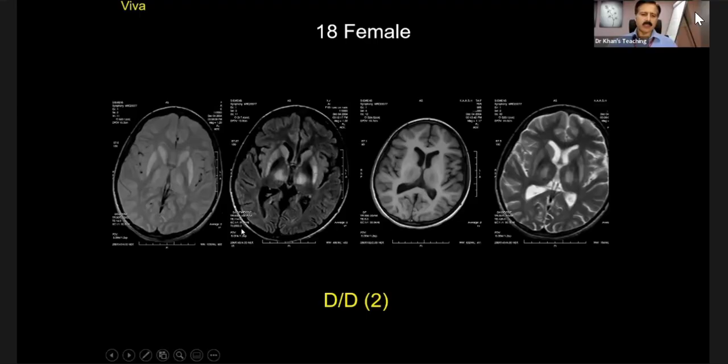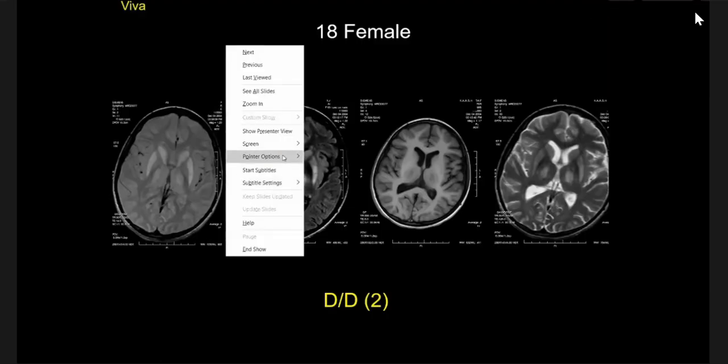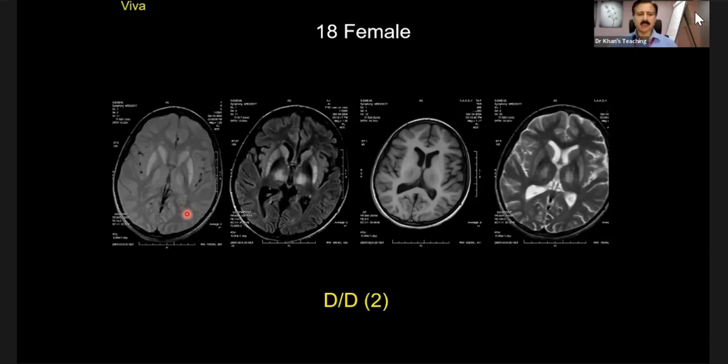Okay, fine. By the way, you called it a SWI? Is it T2 star? So this is a PD weighted sequence. On a PD weighted sequence, please remember that the CSF is equal in signal intensity to the gray matter, so the vessels appear as a filling defect. As I told you in the beginning also, PDs are out of fashion these days. But having said that, this is a PD weighted sequence. So PD, FLAIR, and a T1.